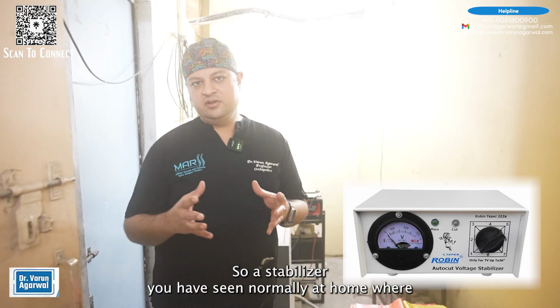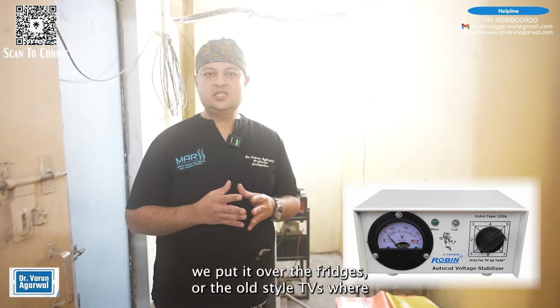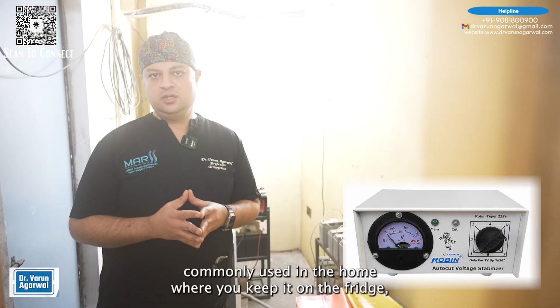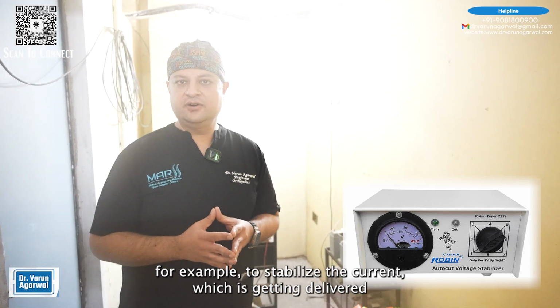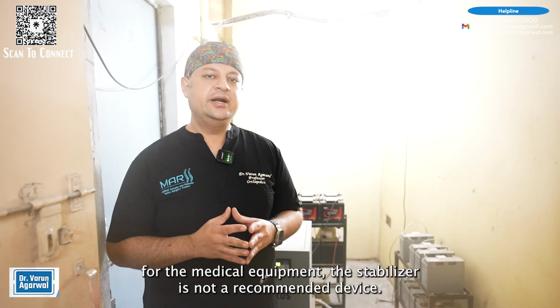So a stabilizer you have seen normally at home, where we put it over the fridges or the old style TVs, where it is commonly used in the home, where you keep it on the fridge, for example, to stabilize the current which is getting delivered from the powerhouse. For the medical equipment, the stabilizer is not a recommended device.